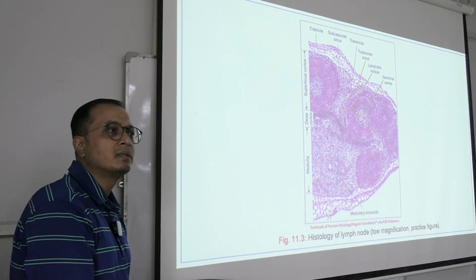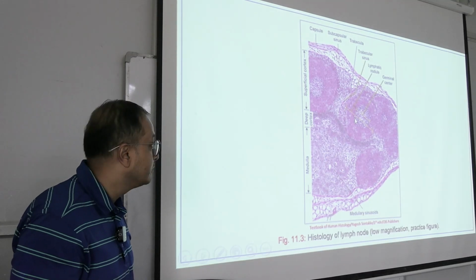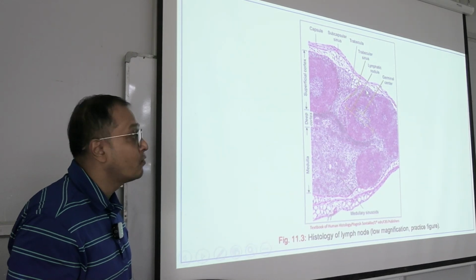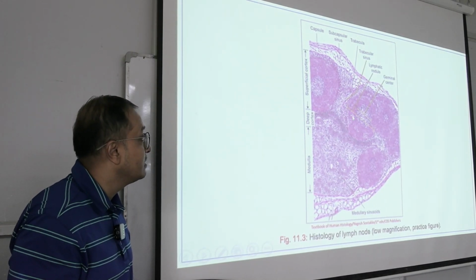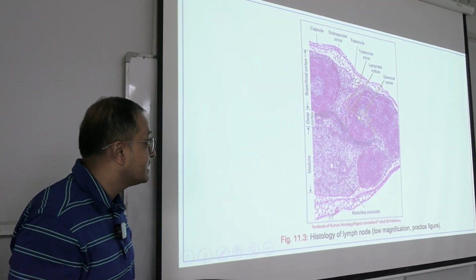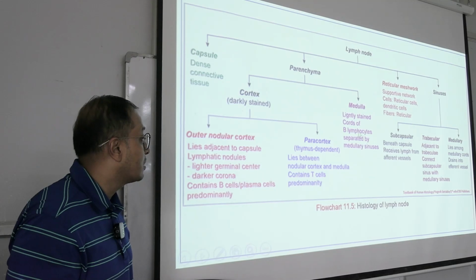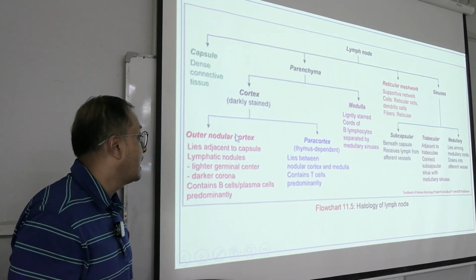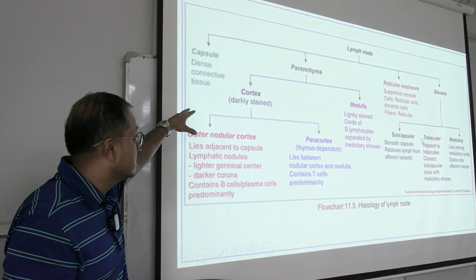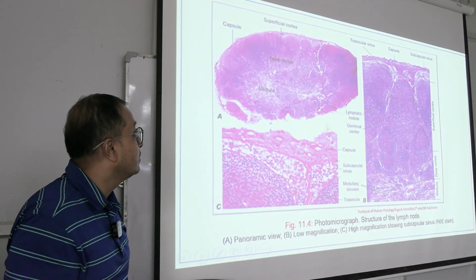In anatomy, we are going to see the normal slides that hold normal healthy lymph nodes which have this particular architecture present. Clear? The capsule is present, and under the capsule, this particular space we will be looking for. Then cortex, medulla, deep stain, light stain, having these lymphoid nodules, with the central part light stained and the peripheral part deep dark stained, the germinal center being in the central part. So this is the whole story that you will keep in mind, identifying this as a lymph node. Cortex, medulla, sinuses and capsule, and out of these, the subcapsular spaces. So this is how you are looking at it.